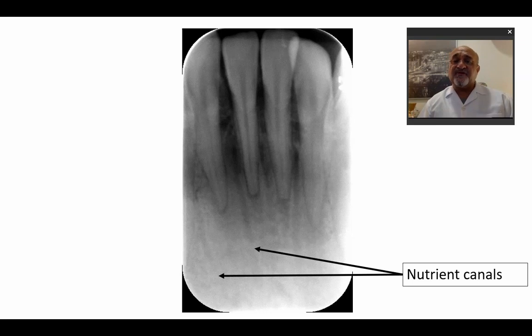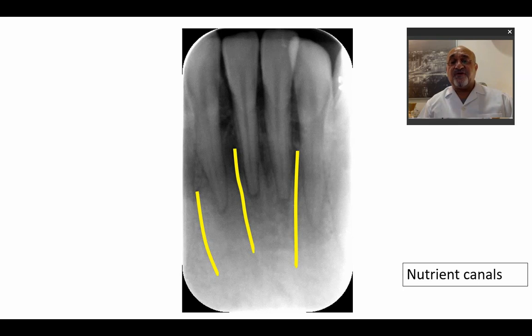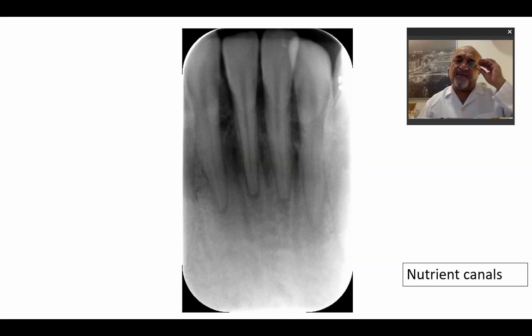It doesn't represent any pathology, but if we see them, we should know what these lines are. Of course, the width of these lines differs from one patient to another. It also differs by the age of the patient. Okay.